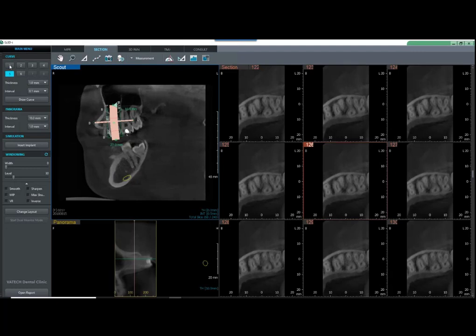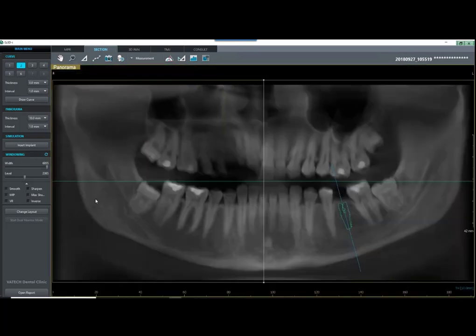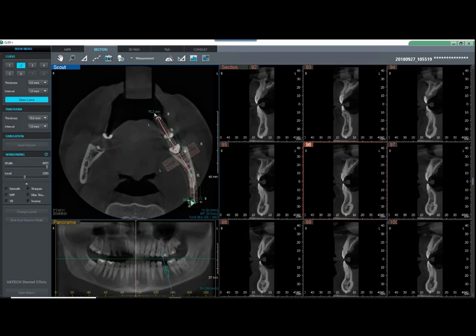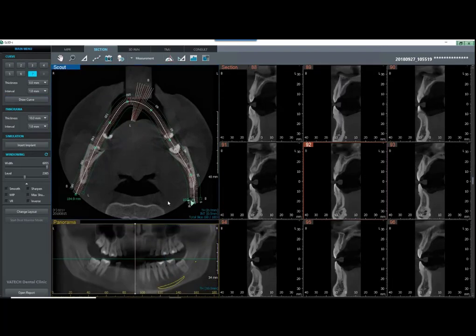Let's go over to our first curve we did. I think it's going to be the second one we want to look at because we enlarged that. Let's note our right side and our left side. I can see my spotlight for right and over here for left. Let's draw our curve opposite. So I'm going to go here, draw curve, going counterclockwise around the arch. And I would probably want to expand this out.